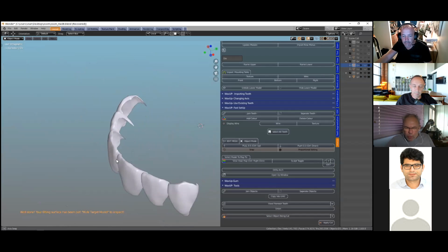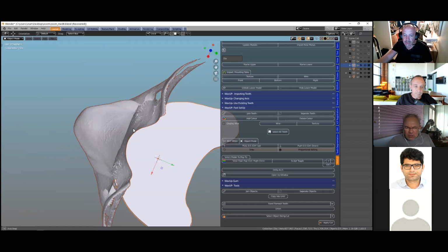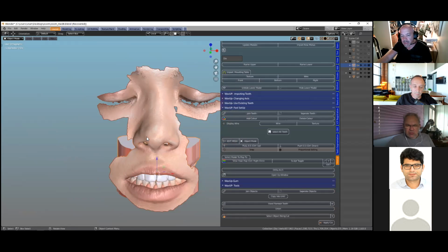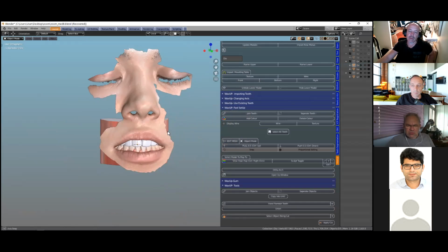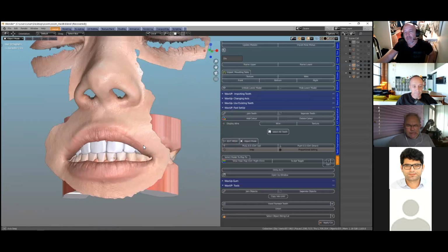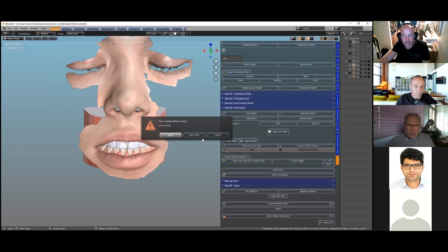So that's one thing I wanted to show you tonight. And let's have a look and see how this patient actually looks. I'm going to put it back to vertex colors. And we can see we've got larger teeth. And I think that looks actually quite nice. Okay, so that's heading into smile design. That's later on. This is just a preview of what can be achieved. Okay, so I'm going to close the chapter with this, and let's have a look at something else.